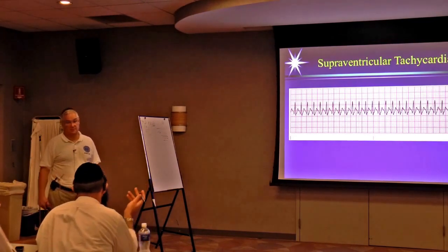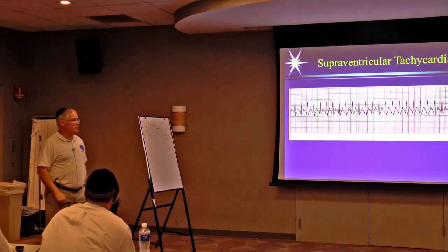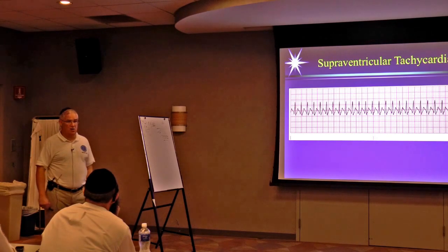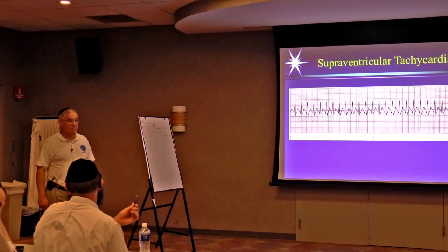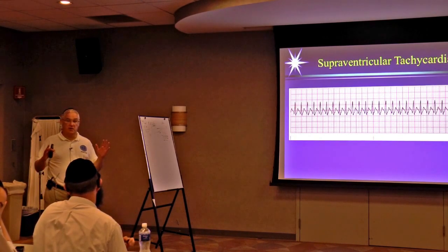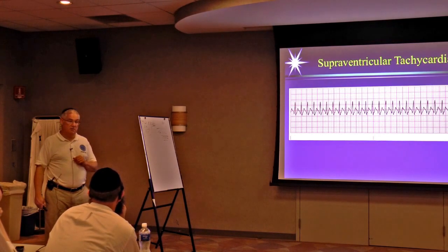Just the numbers. In a sinus tachycardia, you see P, QRS, T, right? You see a clear P wave. The faster it gets, the more motion, you're not going to see it. Right. So that's what I'm saying. But in sinus tachycardia, because the rate's between 100 and 150, it's clearer to be able to see the P waves.